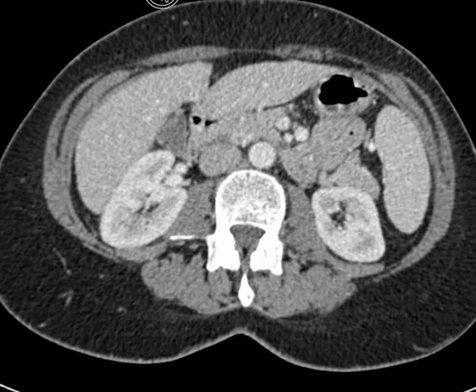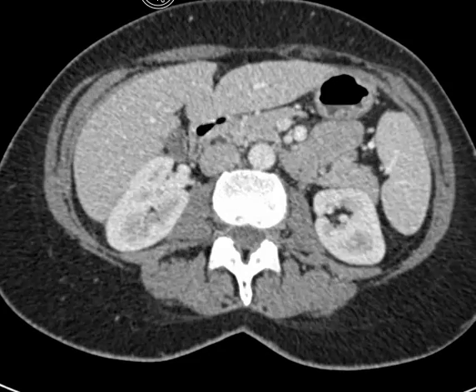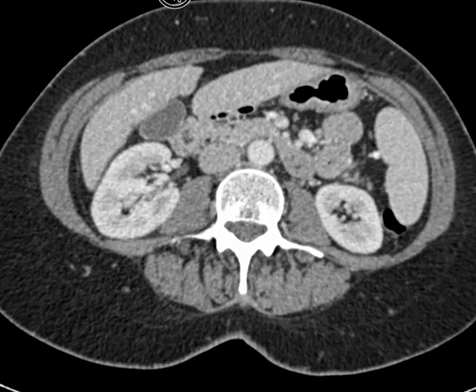Now just follow the duodenum. So here's again the duodenum. It has three portions, a first, second, third, and sometimes people refer to a fourth as well. But here's the second portion as it's headed straight down towards the foot of the patient, and then the third portion crossing all the way over. So here's the rest of the duodenum.